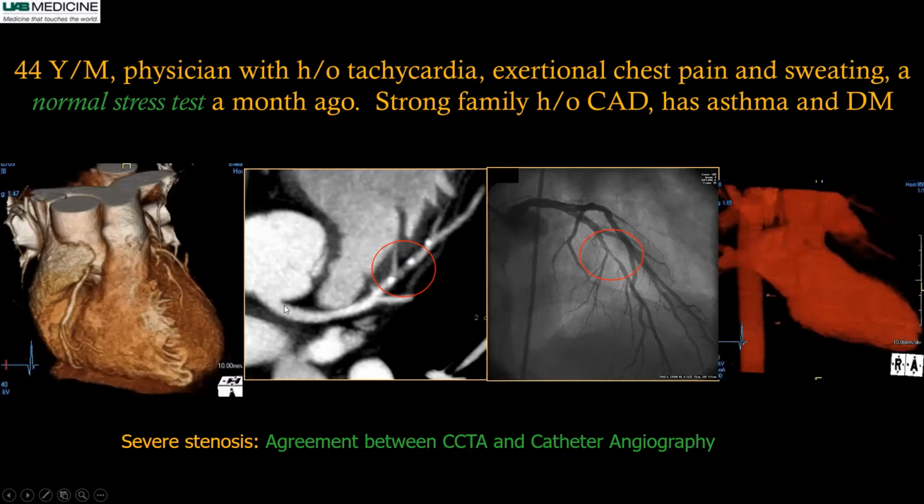So you can see this, it was a good scan, and we did control his heart rate. You can see the LAD, this is the first diagonal branch, and there is a tight stenosis here. There are 2 calcific specks here, and this part of the coronary artery segment near the septal branch is not opacified, but distally there is a good flow.